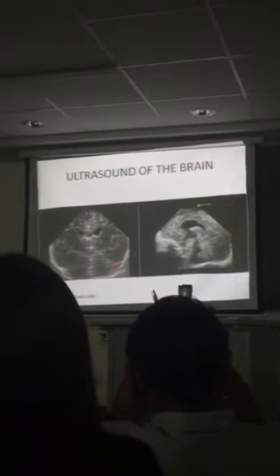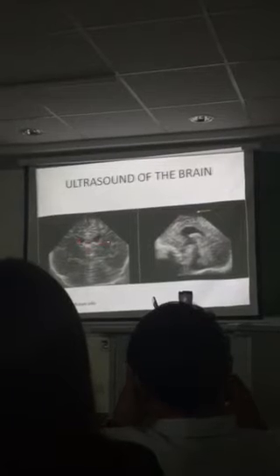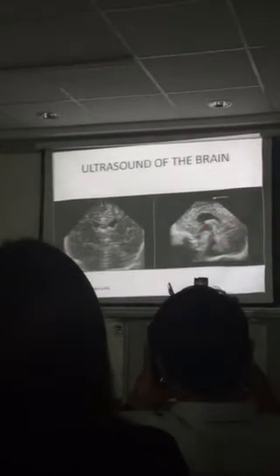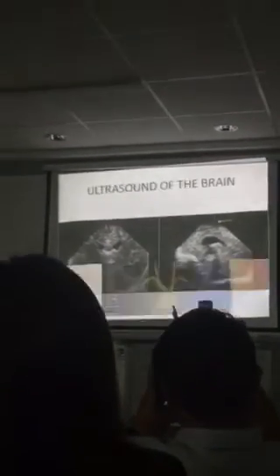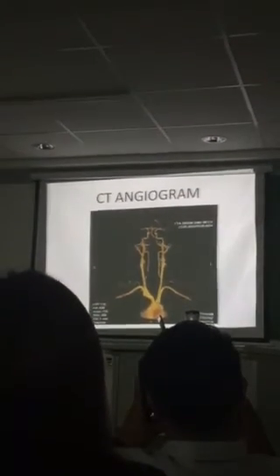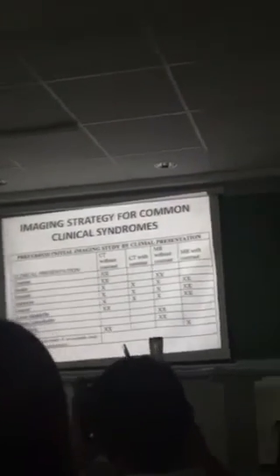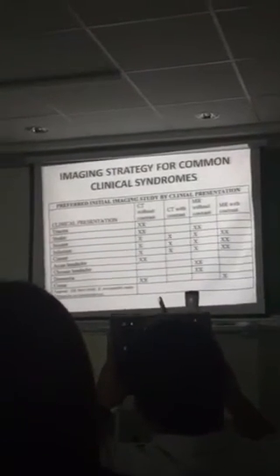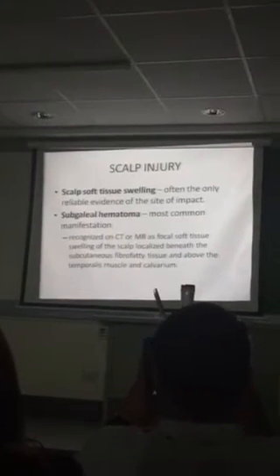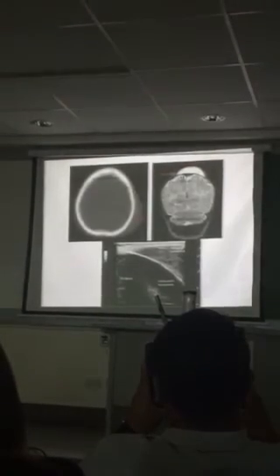There are sulci. What is this? What specific ventricle? Lateral. So this one is also lateral ventricle. Sagittal view, transverse view. CT angiogram. MR angiogram. So just study this, it may come out. For the scalp injury, that won't come out in the practicals, but in the exam, it will.